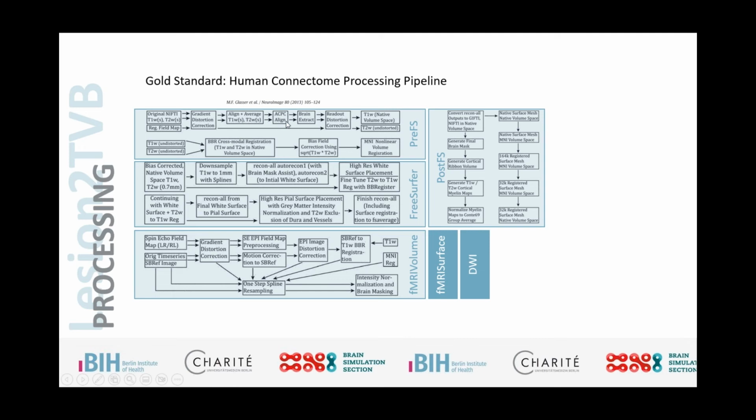We're aligning it to some local landmarks of the brain for them to all have the same orientation in the brain. We're extracting the brain, performing again distortion correction, and ending up with the final T1 space that is somewhat the goal for all other acquisitions that we have for all other modalities to be in that same space, because it's based on the highest resolution data that we have available, which is the T1 image. So we're having the most accurate representation of the actual topology of the individual.